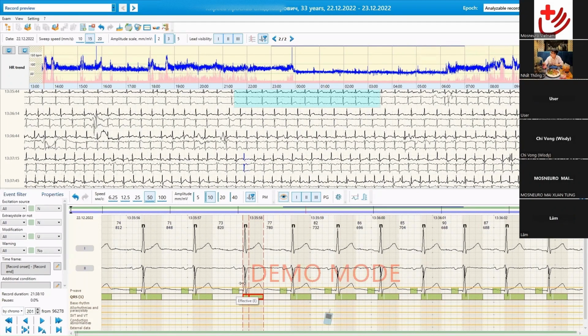Again, this P wave has a bar that shows the start and the end of the P wave, and it also has color coding. You see the text appear when I hover the mouse over the P marker.